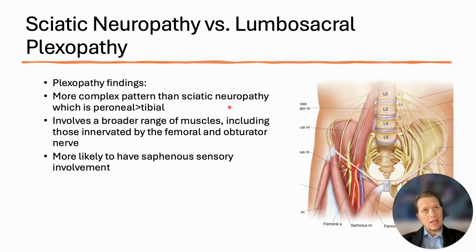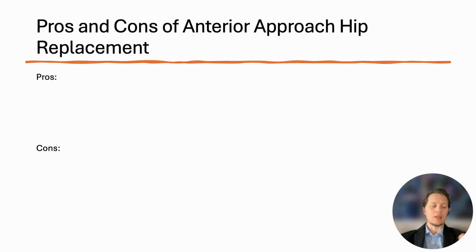Saphenous, right, is more likely to be involved. Not perfect, but in this case, it actually was a pretty clean waveform on both sides. So that was actually pretty reassuring that this wasn't a case of plexopathy.